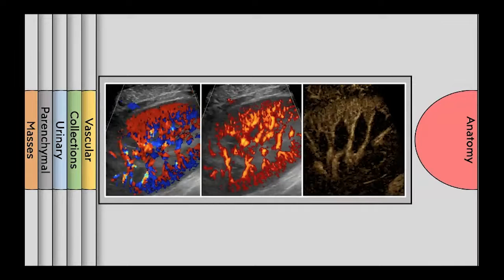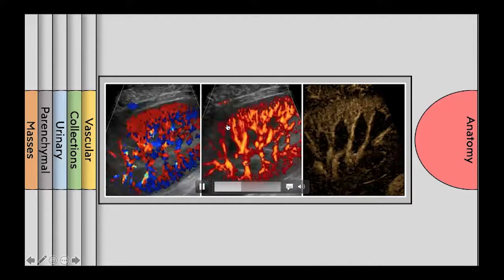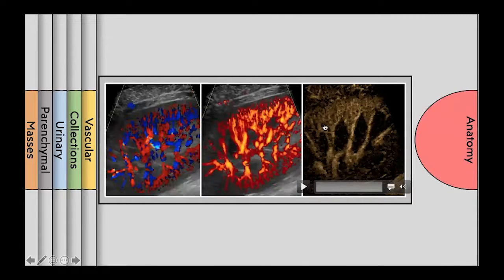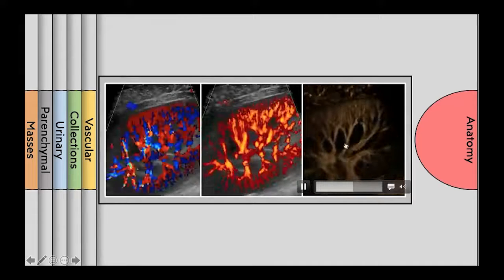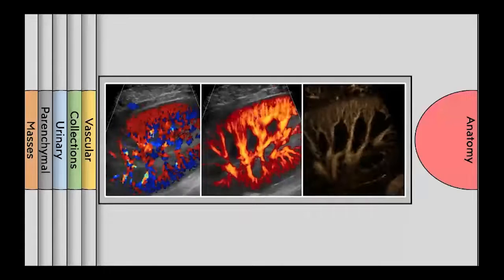Evaluation of perfusion of the transplanted kidney is very important. Ultrasound is our main imaging modality for kidney transplantation. Doppler, both color and power, allow assessment of perfusion, which should be seen extending to the cortex. A newer, non-Doppler technique called B-flow, or microvascular imaging, allows for greater spatial resolution, as can be seen here.